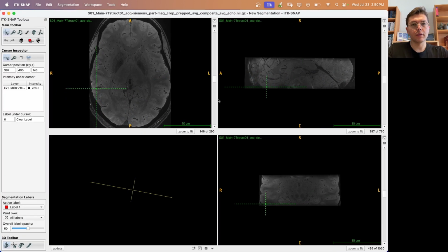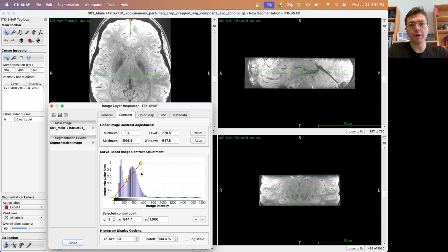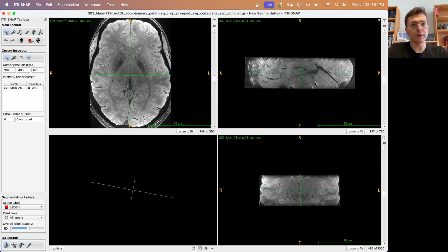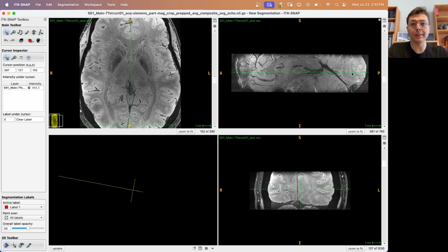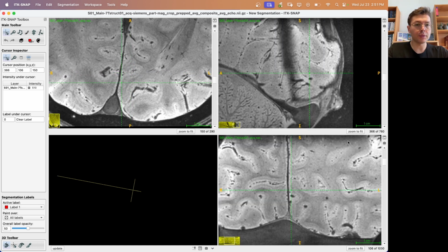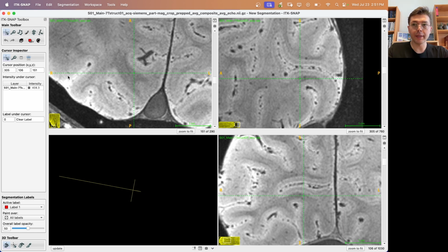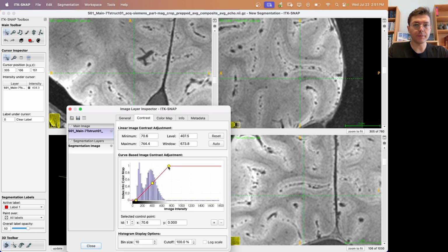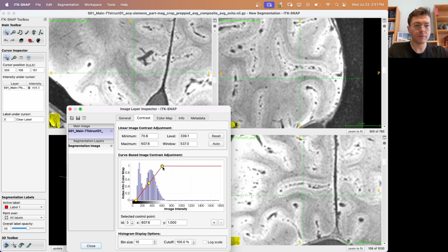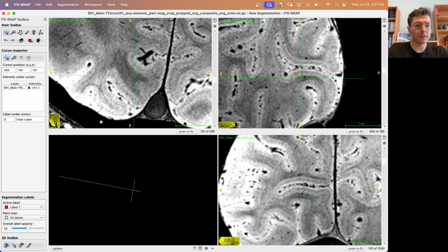So here I have a T2 star weighted image that is recorded at 0.35mm isotropic resolution at 7 Tesla of a living human brain. And this is already pre-processed by Emily. So we have a nice pre-processed data. And this is the average of all the echoes. We had 6 echoes that was averaged to this image. And nicely, just as a quick quality control, you can see that you can even see the cortical layers directly with your eyes in this data. As you see here.